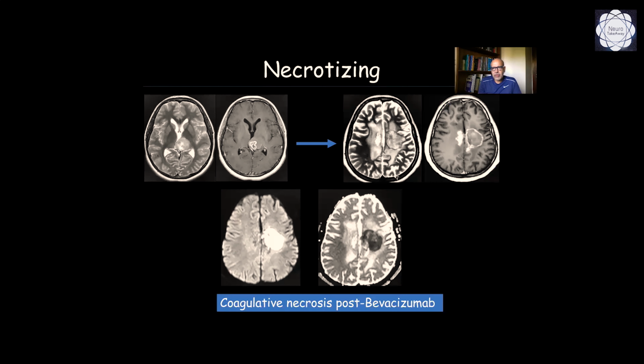Another case of necrotizing lesions is those that occur after the use of bevacizumab. This anti-angiogenic drug may be associated with coagulative necrosis.